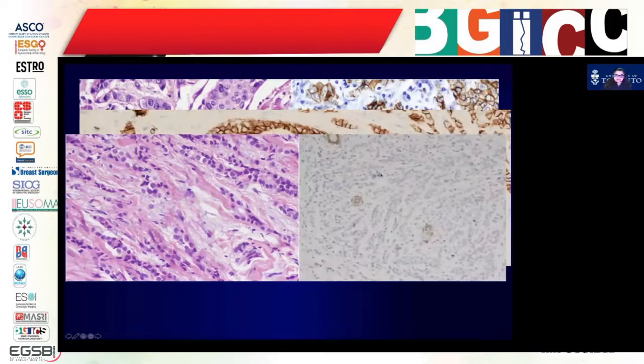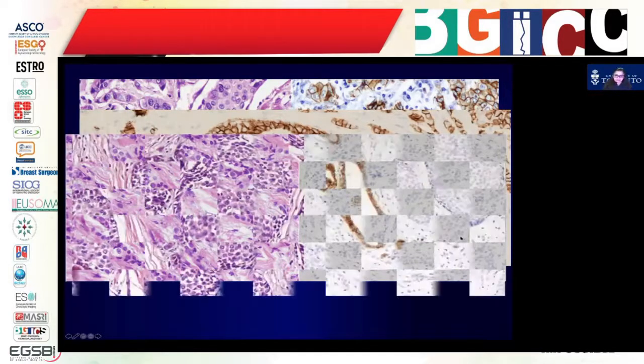So the basement membranes are not stained, and this is a classic appearance of an invasive lobular carcinoma. And these are just the normal ducts which the pathologists use as a standard in that particular slide to match against the rest of the tissue. And so this is normal staining of the ducts, and this is all the abnormal invasive lobular carcinoma.